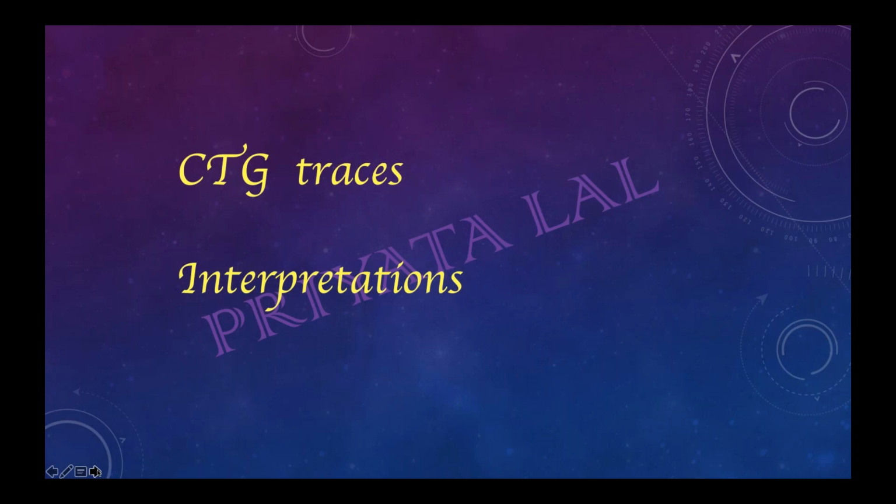But in that situation, there will be many other characters also. You have to comment on variability, and you have to comment on all other features. On the basis of that only, categorization is done. But if acceleration is there, that is a reassuring feature.